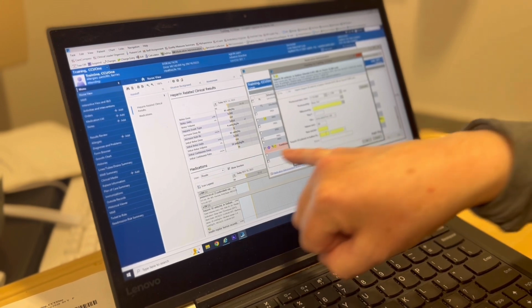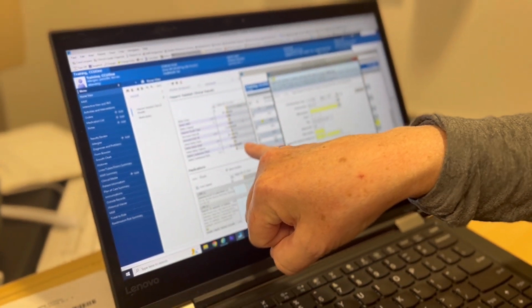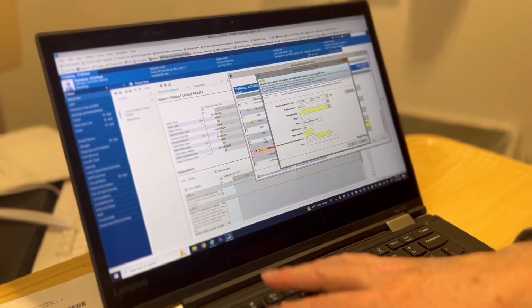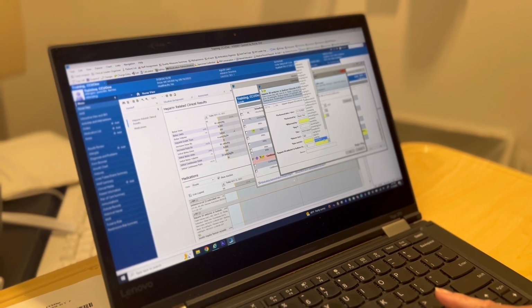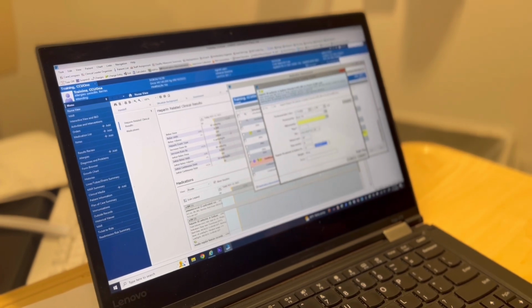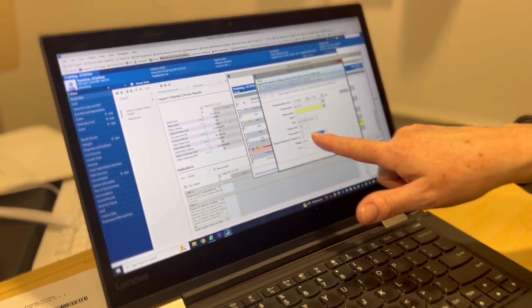So I'm going to go over here and ask, what is my starting dose? My starting dose, initial continuous dose, 18 units per kilo per hour. So I don't have to guess at what I'm doing. I don't even have to memorize anything. I put 18, and it's units per kilo per hour, which is the very bottom one right here. And it automatically filled in my rate. I don't have to touch rate. I just have to touch the dose.